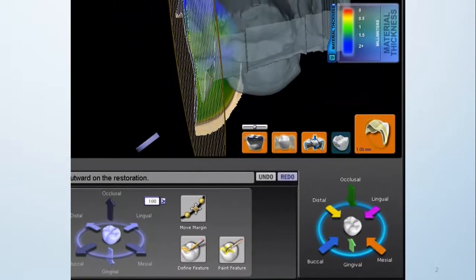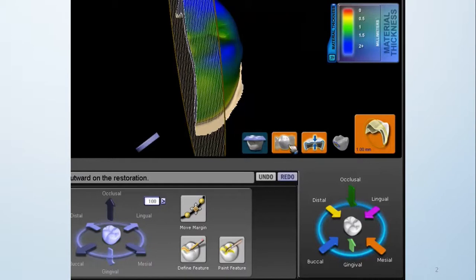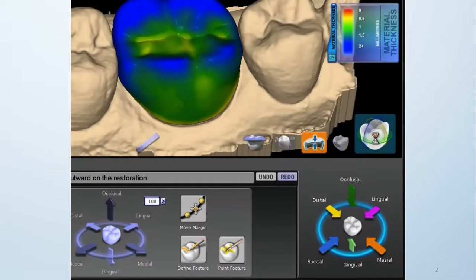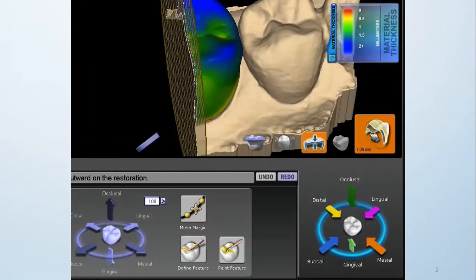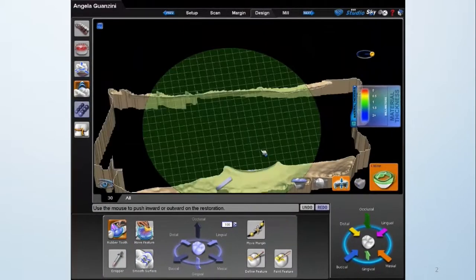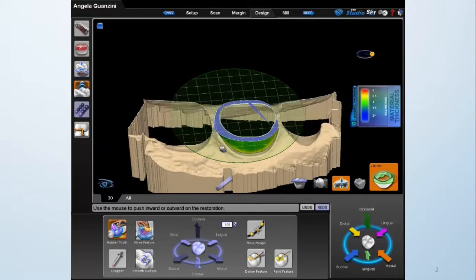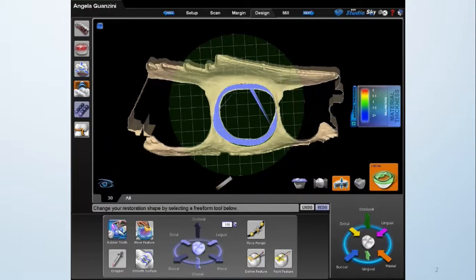So how many of you have used negative dropper? And I can't tell you enough, negative dropper must be used carefully. You want to use it in that negative 0.03-ish from an intensity level when you drop it down. The gingival, sorry, we're talking here about the slice plane. Look at the slice plane. Using it from the gingival perspective, how that allows you to close up those food traps.